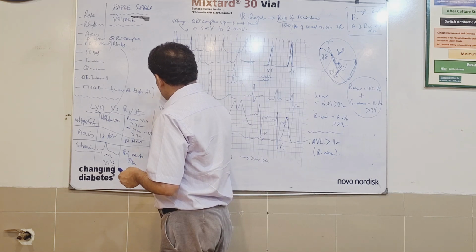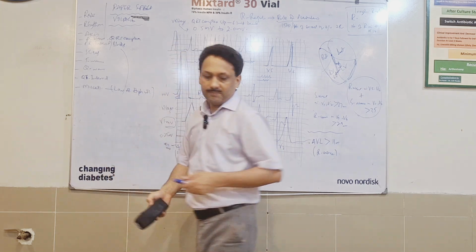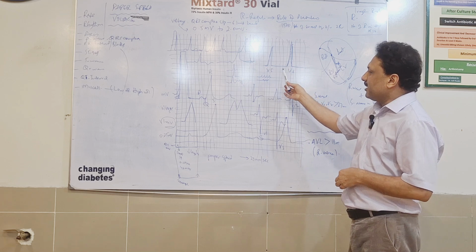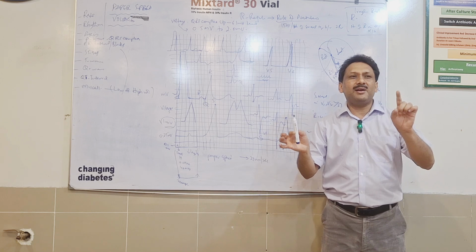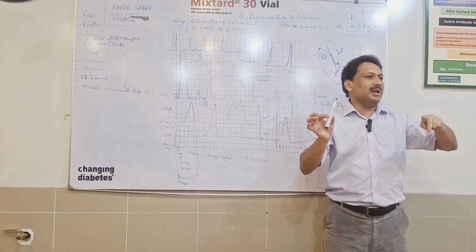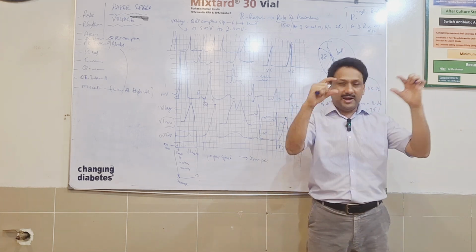We next move on to P wave. P wave on ECG represents atrial depolarization. Whenever you are going to comment on P wave, comment basically in lead number 2. Lead number 2 is also known as rhythm lead. So focus on that lead number 2.